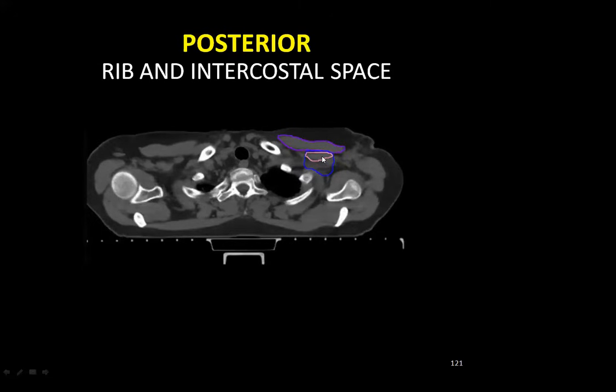If you have interpectoral nodes or a multiple massive axillary burden, you can include the pectoralis minor muscle, but when there is N0 or no interpectoral nodes in the pre-op and pre-NACT setting, don't include the pectoralis minor muscle. But there are different guidelines; you can include the pectoralis minor muscle inside the axillary group or not.